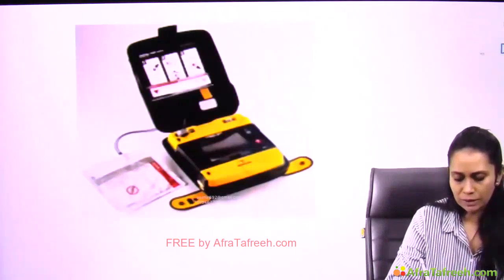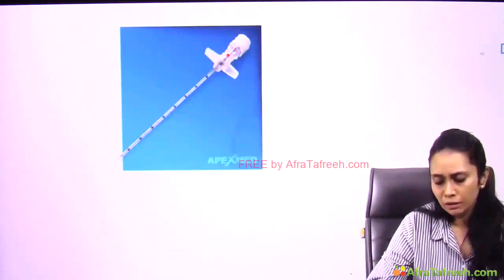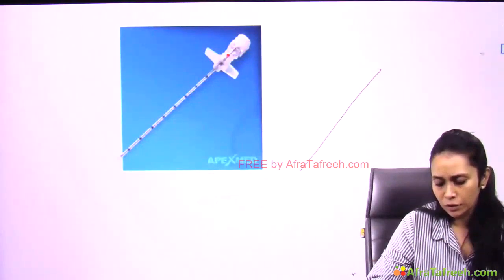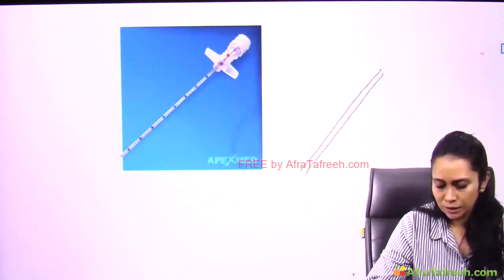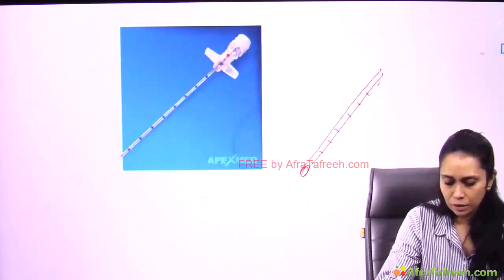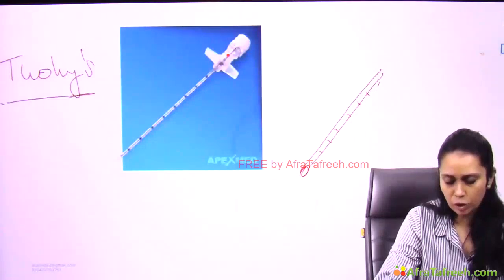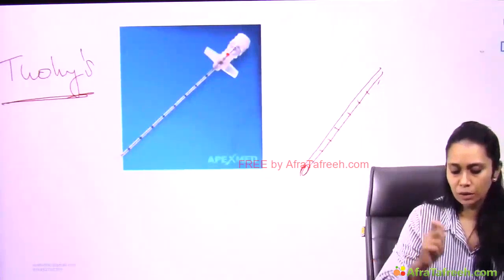Okay. And this last image, this is Tuohy's needle. This is the needle which we use for epidural. See, this needle has thick gauge with 1 centimeter gradation on it. This is Tuohy's needle which we were talking about. So it has 1 centimeter gradation on it, right, everyone? So this is all about our Tuohy's needle.